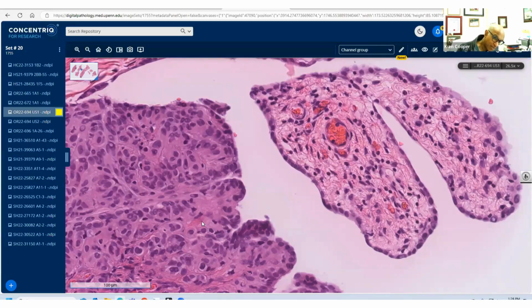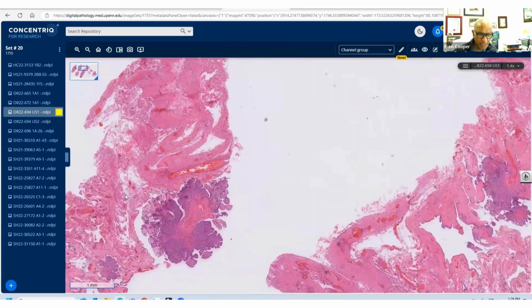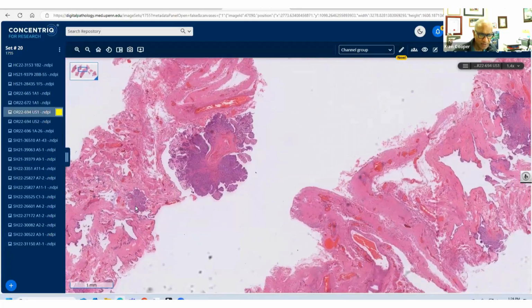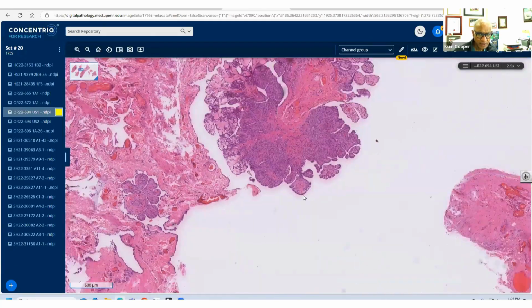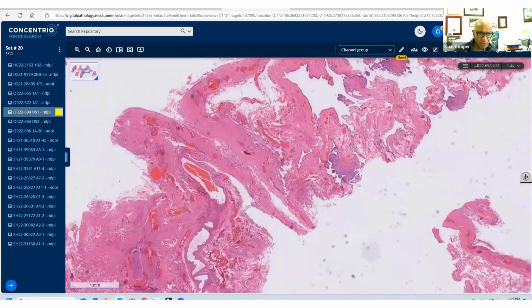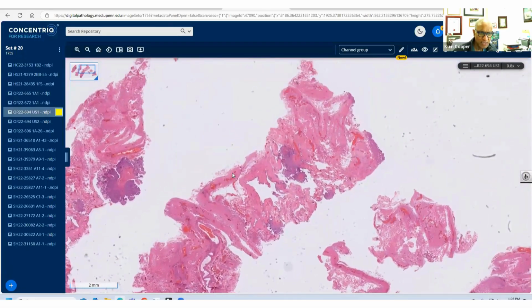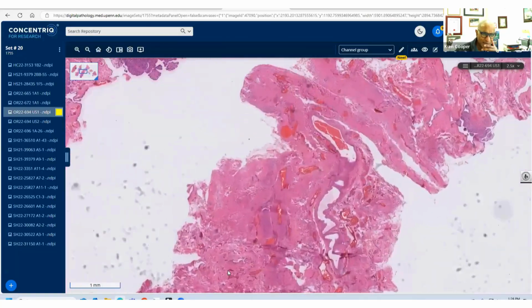This, in turn, is in the hydrocele sac. So it's paratesticular. It's not in any of those two sites. And let's go back on low power. It's multifocal. There's a spot there. There's a smaller one here. There's a smaller one there. And then here, the other areas, you're also getting the same process. So it is multifocal papillary mesothelial. And the question is, what are we going to call it, right?